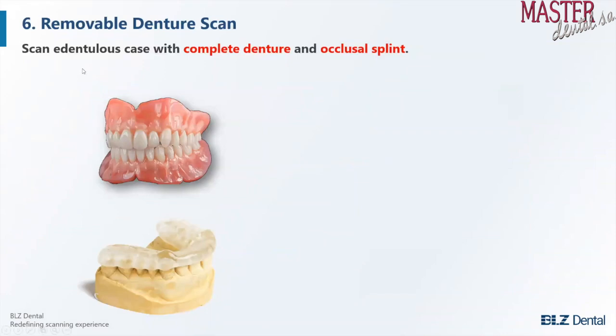And the last new function we want to share today is removable denture scan. For removable denture scan, we now have two different kinds of scanning types.